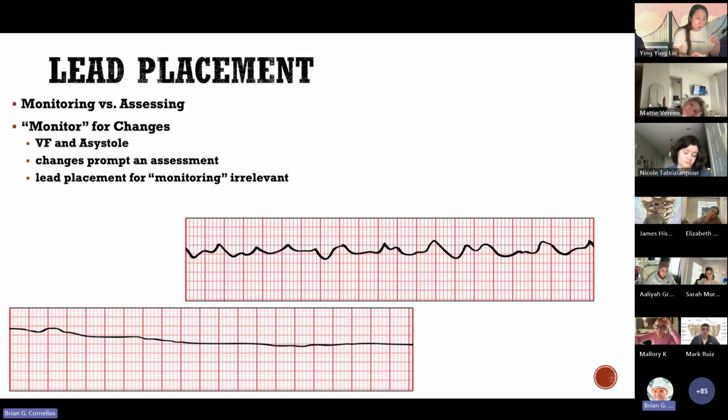Yeah. So lead two and lead three are the inferior wall, and we'll look at some easy ways to remember the 12 lead stuff in just a minute. Remember the other day we talked briefly about acute MIs, and I said that if you wanted to diagnose somebody with an acute MI, you needed to be able to see ST changes in two contiguous leads, right?